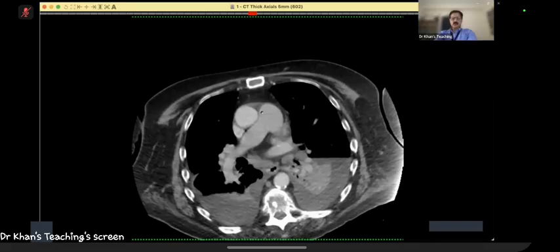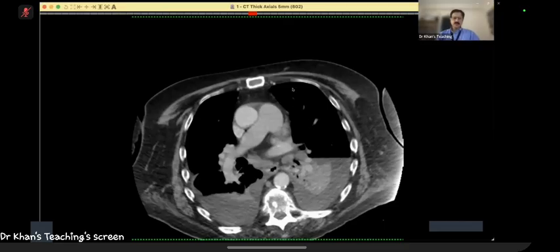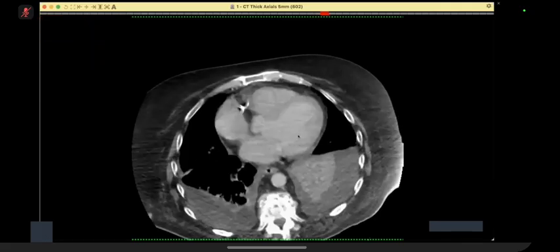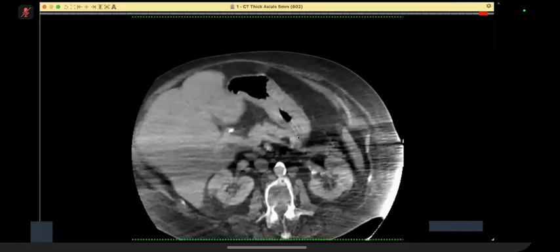You can ask for the mouse again if you cannot. Okay. Yes, please. Okay, I'm going to scroll through from up to down if possible. Okay.